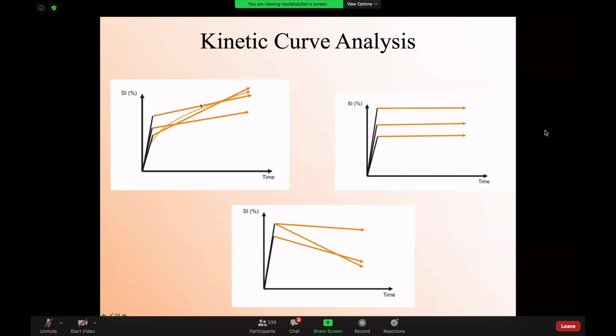If you put your ROI or you do your kinetic assessment for that lesion, and you see that kind of curve, then most likely you're dealing with a benign lesion. The second curve is what we call a plateau type of enhancement, where the lesion will take enhancement within 90 seconds, and then over the next 6 minutes, it will plateau. It will not change. It could be benign, could be malignant. However, they found that 60% of the time of this type, it's usually malignant.